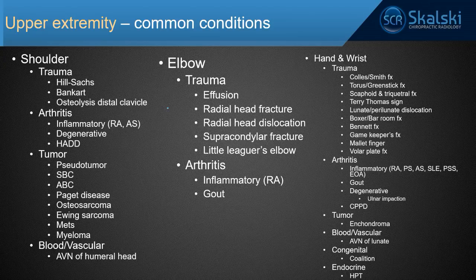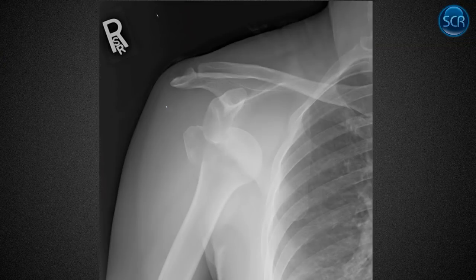So, all right. What are we seeing here? First case, shoulder. Clearly, we have a glenohumeral dislocation, and it's anterior, which is almost always the case. So it goes anteroinferior. On the front view, it's hard to tell; it's just a standard AP. When the shoulder dislocates, it goes subcoracoid. The coracoid's an anterior structure, so if it's up here underneath the coracoid, that's an anterior dislocation.